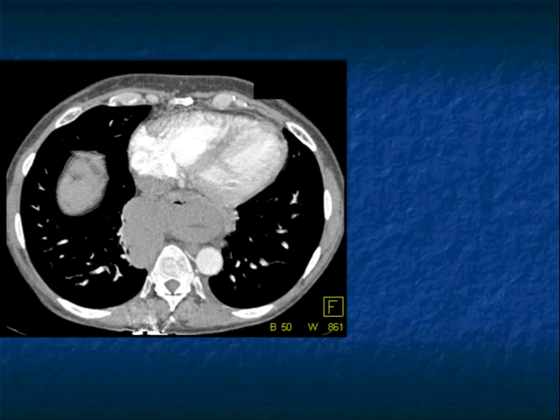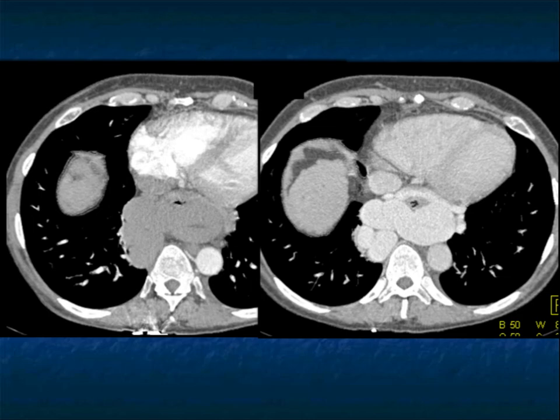Now, one of the things I also like to mention, in this case, I've only showed you one slide of the liver. If I showed you more images, the liver would be cirrhotic. Now, the reason I'm making that point is when you look at the esophagus here, am I dealing with hiatal hernia or lymphoma? There's big, bulky, soft tissue. I see the lumen of the esophagus, but what is all this mass? Well, if you wait about 30 more seconds or so and you scan the patient, you realize these are all large varices. Varices of the lower esophagus can simulate malignancy, can simulate adenopathy if you only have arterial phase imaging or you have non-contrast CT.